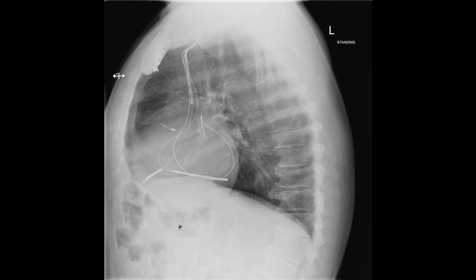So this is the situation when, in order to reach a defibrillation threshold during the period of testing of the defibrillation coil, it was necessary to put an additional defibrillation lead in somewhere. And I've shown a case previously where the additional lead was placed in the azygous vein intentionally. Usually I think they don't like to put this in the coronary sinus, at least initially, and I don't know the sequence in which this was done, because you may need the coronary sinus to put a coronary vein lead in.